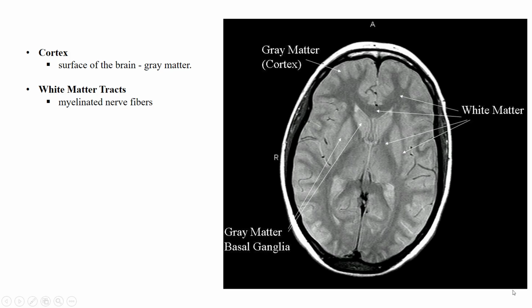And this is one more image of the gray and white matter differentiation. This is a proton density weighted MRI scan. You're not able to visualize this in e-anatomy. They don't have proton density, but they do have FLAIR, which is very similar in its differentiation of the white and gray matter. So do take a look at the FLAIR images as well, and they may help you in studying your deep set gray matter.